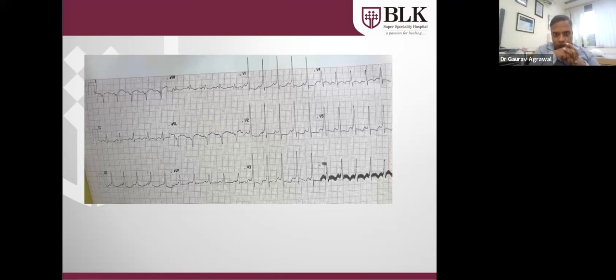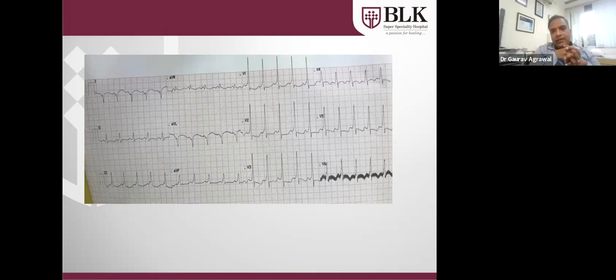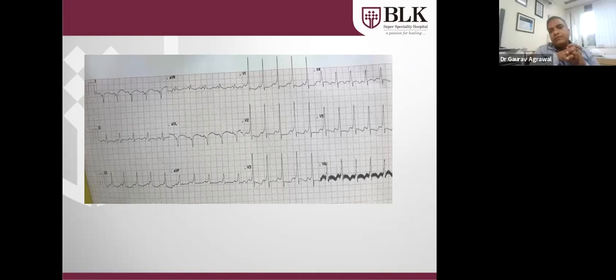See V1, V2, especially. Arun? Narrow QRS complex, sir. Yes, agree. Sir, narrow means it is normal for the age. Yes. What is the relation between PQRS? The upstroke of QRS is slurred.